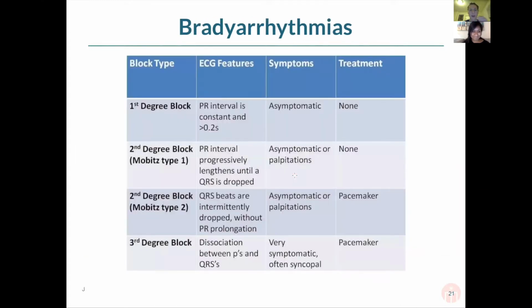Okay. So now we talked a lot about the fast stuff, or where we need to worry about for the fast stuff. I want to talk a little bit about the slow things you have to worry about. When someone's heart rhythm is slow, what sort of differentials come to mind? The big ones are here on the screen, and these are the ones that they are going to test you on for the purposes of the STEP exam. And we're going to break it down, and you'll see lots of examples of these as well.